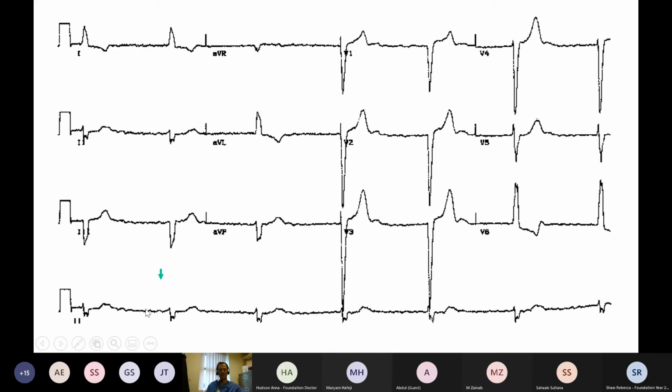but can you see the morphology of these is just about the same, but it's not really the same when you look in the other leads. And the P wave morphology ought to be the same beat to beat. It's not always in sick sinus syndrome, but that's at least you'd be seeing clear P waves. What you're seeing here is an irregular baseline. And in the rest of the ECG, you can't see anything that looks like a P wave at all. So this is just the irregular baseline, and this is atrial fibrillation. So is everybody happy that we've got LVH and atrial fibrillation and it's just slow AF?